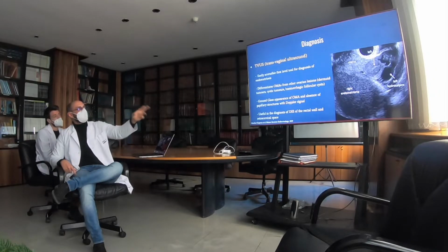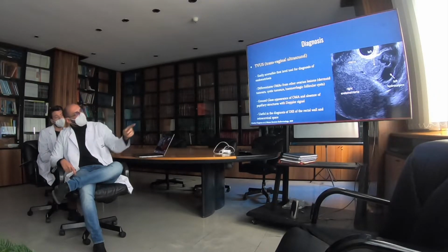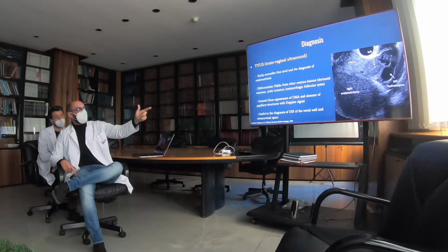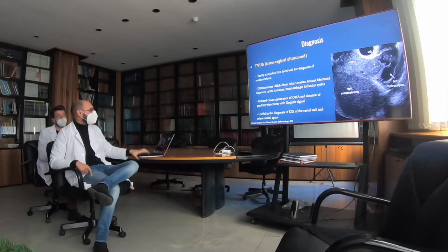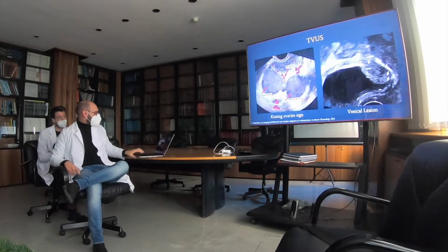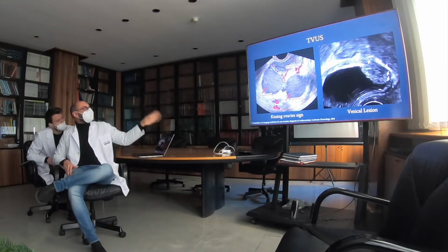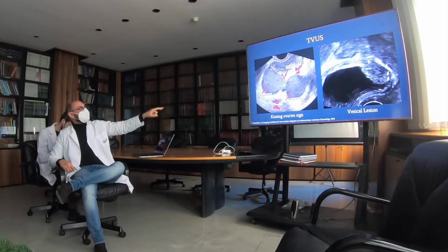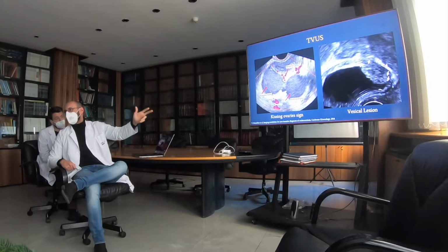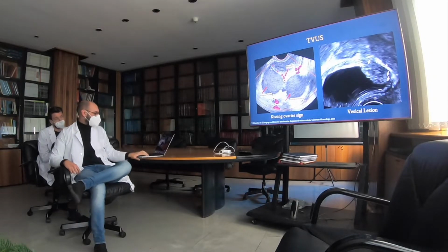In this image, we can also see a left hydrosalpinx, which is this dilated tortuous structure filled with anechogenic fluid, distinct from the adnexa. In this image, we see on the left side 2 endometriomas, confirming that there isn't any Doppler signal inside of them, and on the right side we see an intrinsic endophytic vesical lesion. We recognize the bladder because of its anechogenic content.